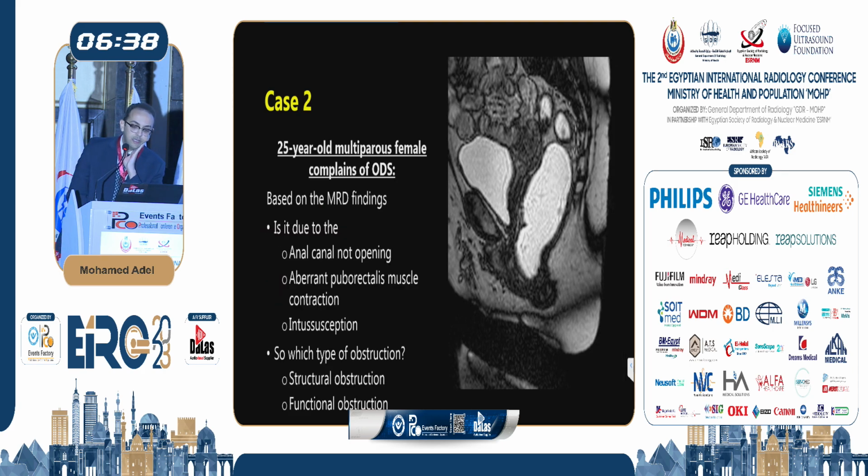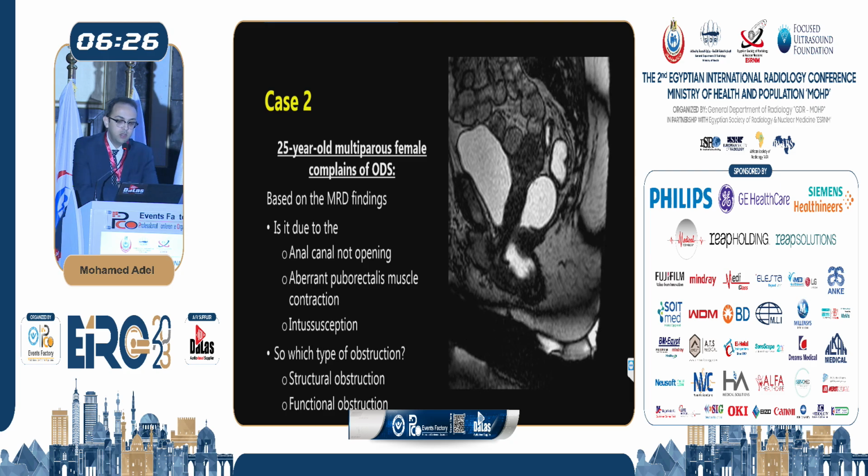Let's move to a second case. This was also a multiparous female. She was surprisingly very young, she was 25. She came complaining also of obstructed defecation. So I would like you to look at the image and tell me what you think.